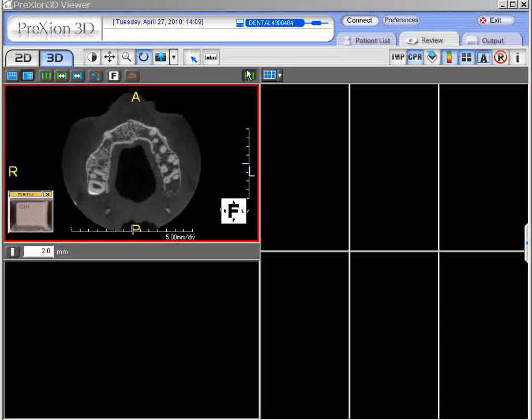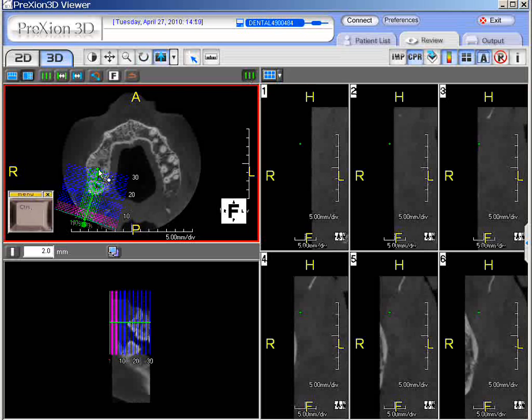If you don't see that, sometimes what happens is the visible cross-section line is off. See, now I'm pressing the control key, and I don't see my little visible cross-section line or the light bulb. Go up to this enable visible cross-section line, click it once, hold the control key again, and then you're going to pop up your little icon that is related to CPR. Okay, so you're going to do that.